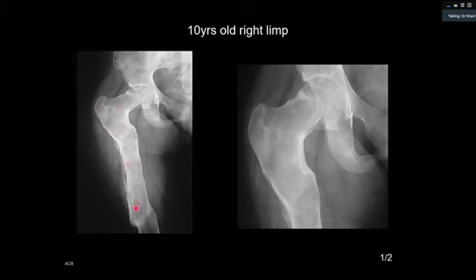With that, you can infer what has happened, that in the past there must have been a fracture here. And you can see that there must be a plate here and there must be screws here. So this is the story, that there was a point when there must have been some internal fixation. This is whatever has happened in the past. But what I wanted to highlight is this kind of cases which can come in FRCR. We call it a story case. It tells you a story.